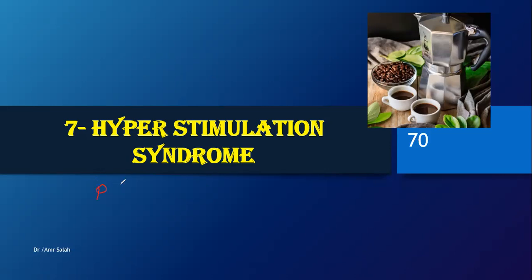Remember, in the PCO, we had the PCO appearance when the ovary was enlarged and has peripheral follicles, and they were small, ranging from 20 and above. PCO syndrome necessitates that there is the picture of PCO by ultrasound and other laboratory results or clinical symptoms.